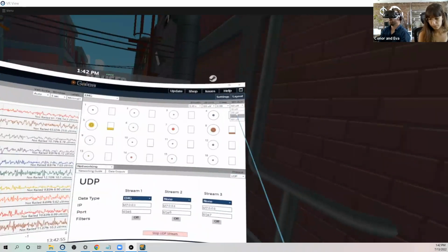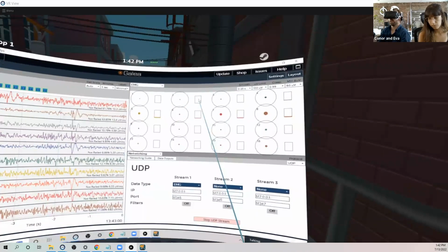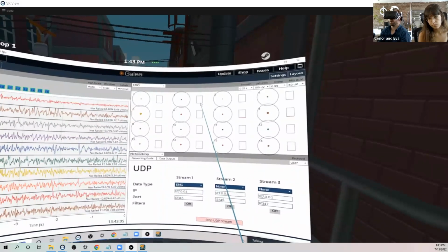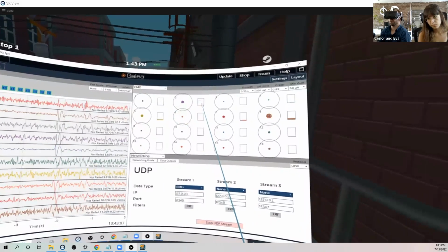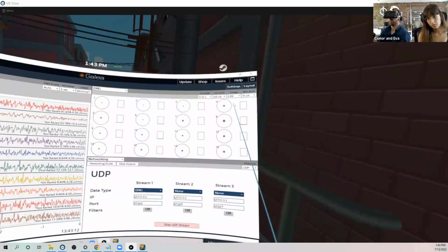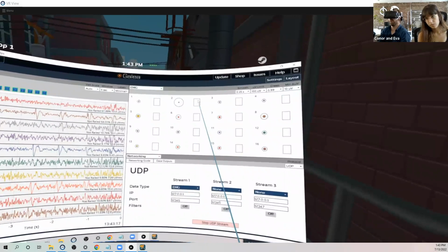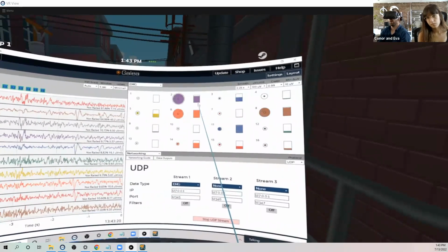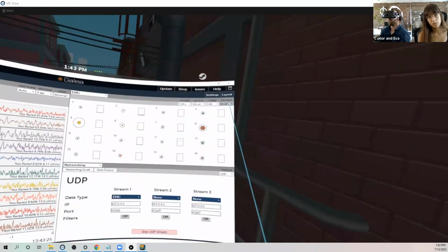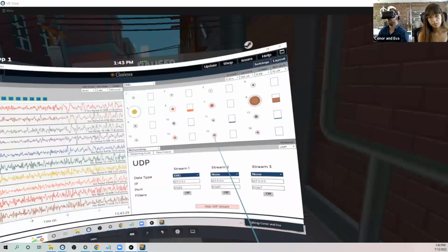So you'll notice if I go all the way up to 80, I'll flex my right cheek. Okay, that time I actually did fill it all the way up, but I'll flex a little bit. You can see that I'm not necessarily filling the bar the whole way. But if I drop this down to 10 and try to flex the same amount, it's much easier to fill the bar now. So if you're having a hard time tripping the switch, just lower that value and maybe decrease the size of this window. There's a couple variables that you can tweak here.